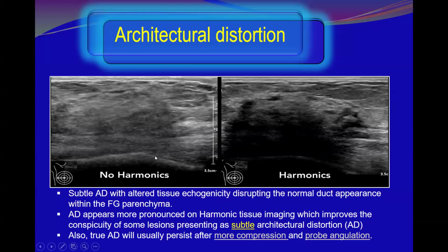Okay, we said that there is a subtle architectural distortion. When they applied harmonics, this is from the literature, by applying harmonics, the subtle architectural distortion becomes more conspicuous.